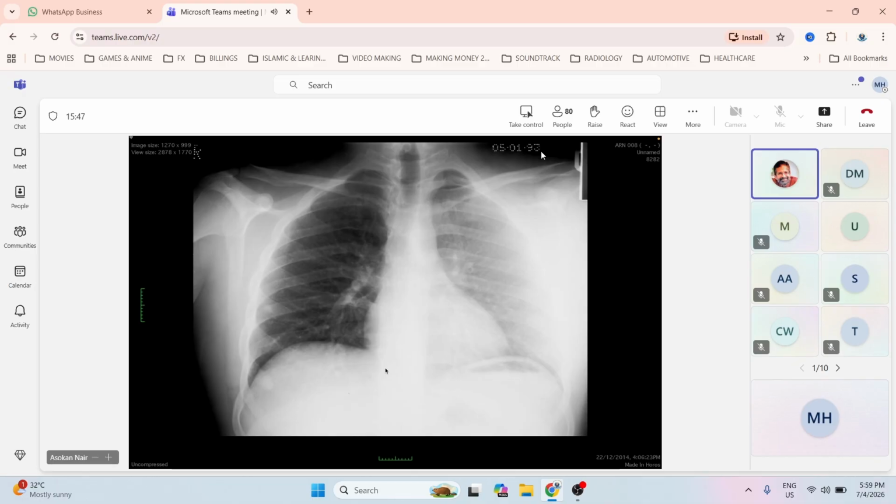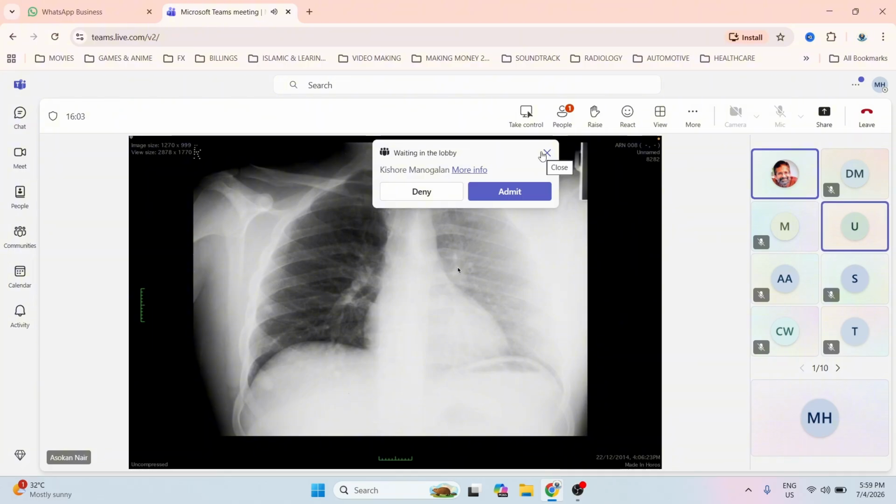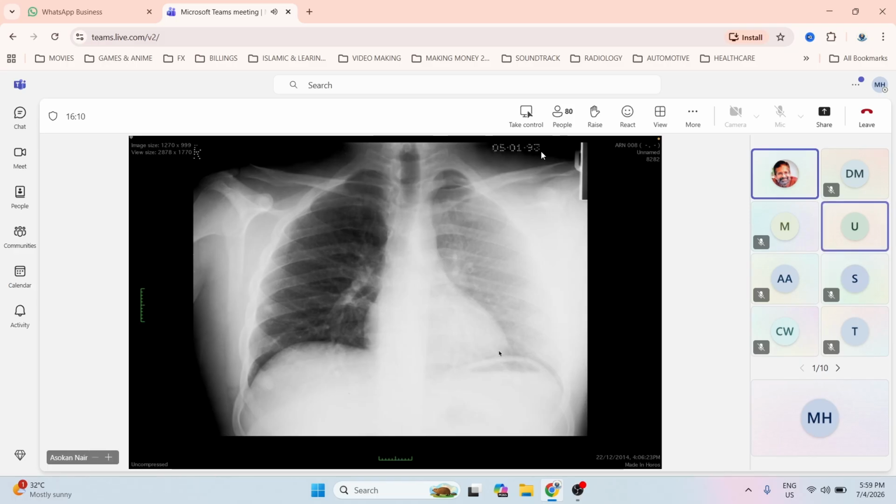Many of you have not thought about that. You see the diaphragm so well, the right heart border, the left heart border so well. You see the aorta and the mediastinum so well. You also see the hilum so well. Everything is seen well. So it cannot be inside, because if there's a mass butting the diaphragm, you lose the diaphragm. That means there's no silhouette, because all these structures have air around them. So that's a silhouette sign. It's a very useful sign to analyze a chest radiograph.